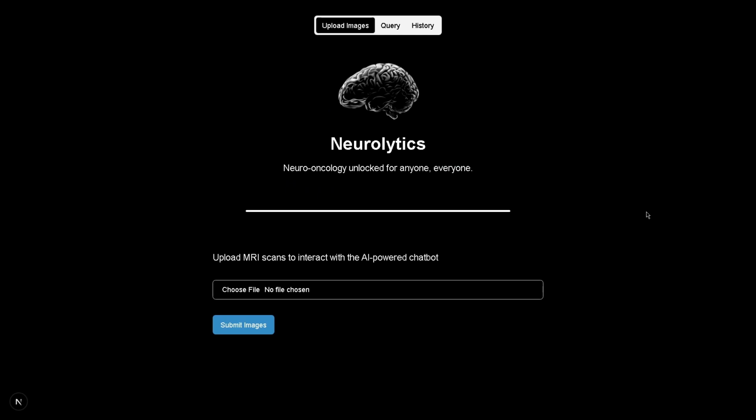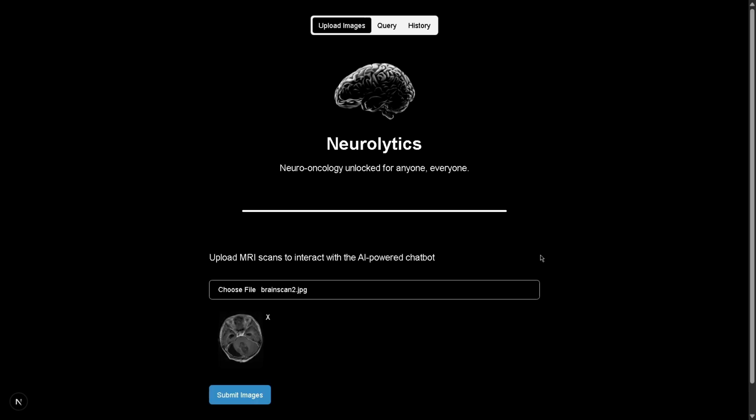Hi everyone, we're Neurolytics. We're an AI-powered suite of technologies for MRI analysis and 3D renditions. Our target audience are doctors who have trouble getting peer-reviewed diagnoses and med students who need MRI training, such as radiologists. Let's actually see Neurolytics in action.